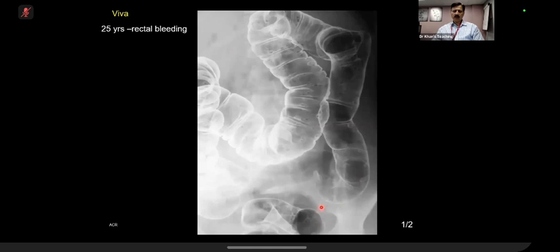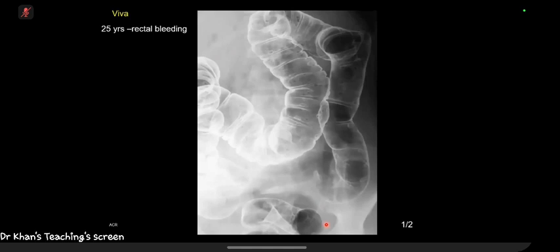So now you've picked up polyps. What is your diagnosis and what are you going to advise? So as there are multiple, I'm keen about familial adenomatous polyposis syndrome. I'm concerned about familial adenomatous polyposis syndrome, so I will further go for family screening or colonoscopy.